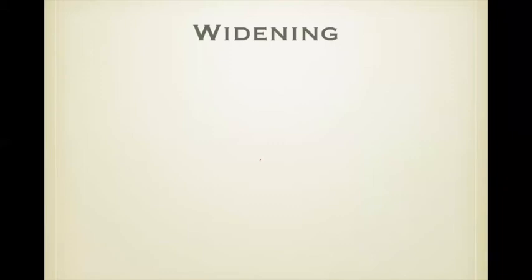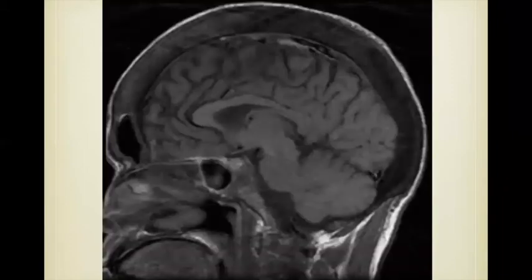We'll move on now to widening of the skull. Here you can see on this MR scan, sagittal view, that we have marked widening of the skull that looks to be of uniformly low signal intensity. This is what it looks like on the CT scan. Now, in cases where you have symmetric abnormalities, it can be difficult to discern them. But you've seen a number of CT scans here today and likely in your own experience, and so you should recognize that this bone is sclerotic.